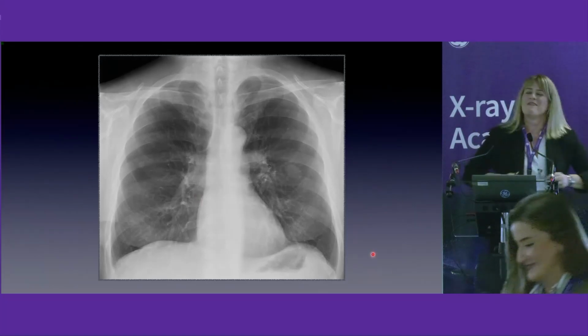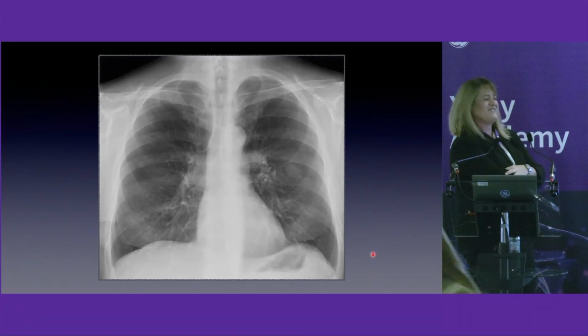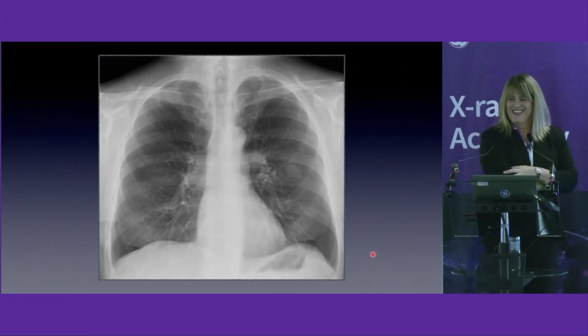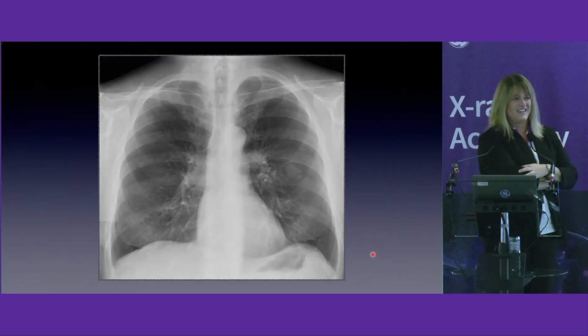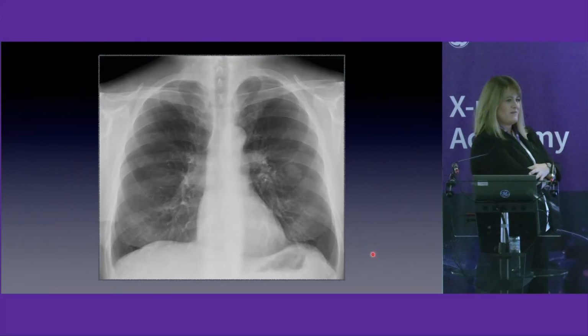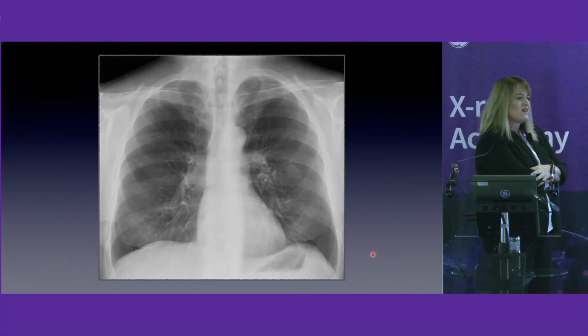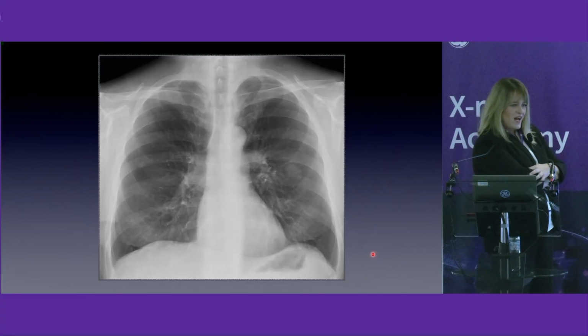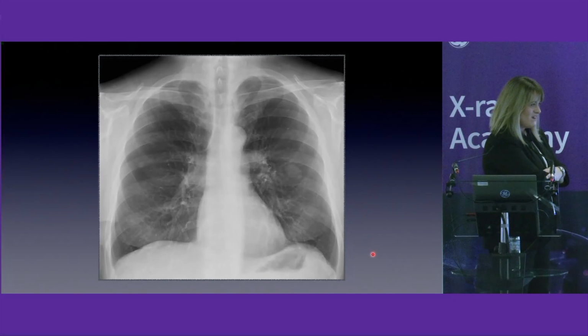Oh, another one. This one is maybe my favorite case of all time. There are nodules, bilateral nodules, but it's very hard to say if these nodules belong to the parenchyma or not.